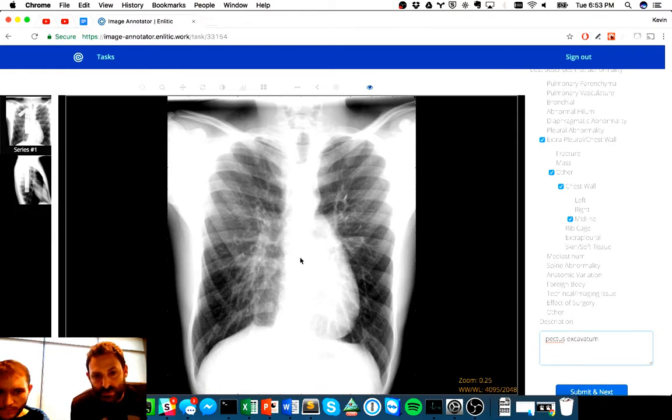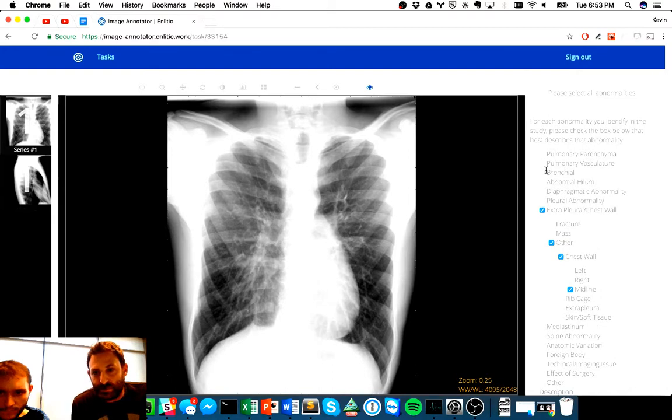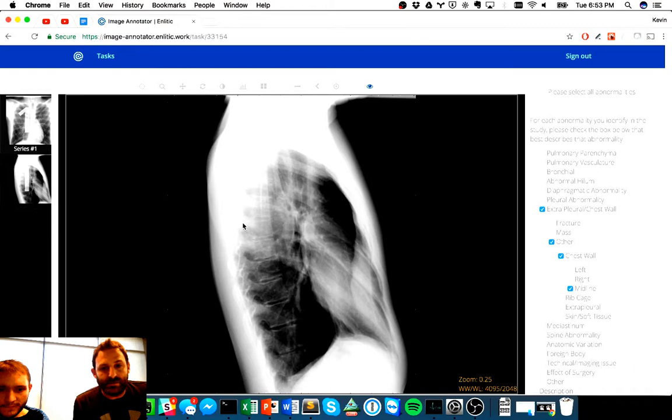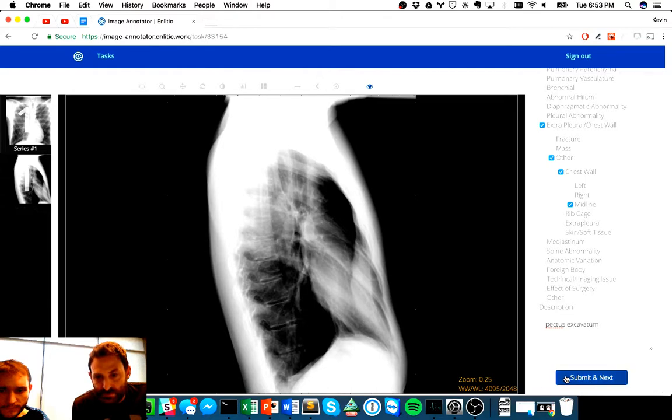Importantly, as I've said, we don't want you to go now and label pulmonary parenchyma consolidation. This is a secondary pattern, secondary to the primary pathology, or the primary pattern, which is the chest wall abnormality. Once we've done that, we're done with that case.